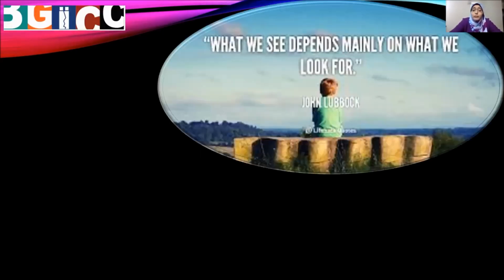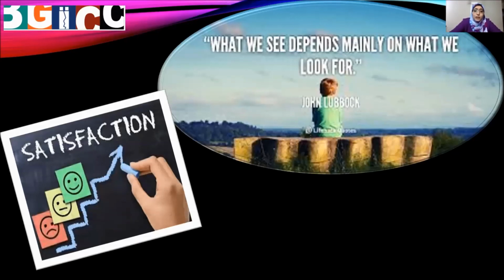So here is a very important message I want to deliver through these cases: what we see depends on what we look for. So I should look for each lesion. I should scan the breast very carefully. I should avoid the sense of satisfaction on finding one lesion, two lesions.